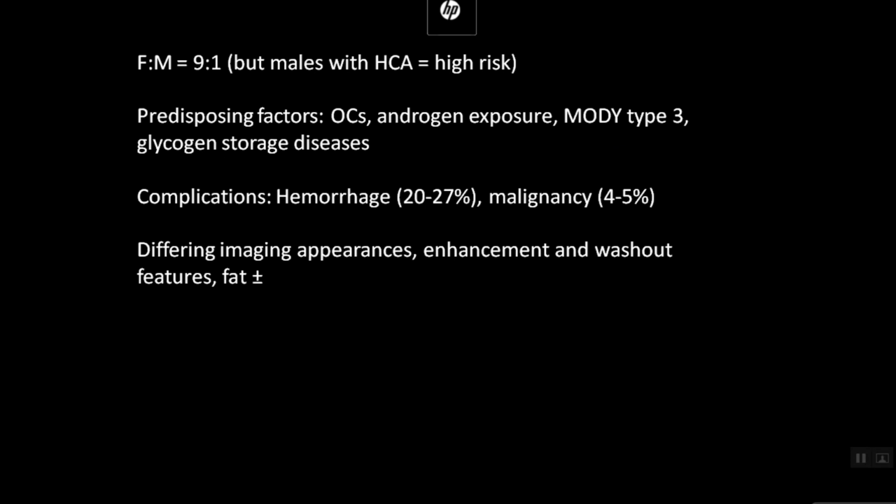Now, you can see any type of imaging pattern with adenoma. Some will enhance, some will not enhance, some will wash out, some will not wash out, some will have fat, some will not have fat. So it's a very differing imaging appearance, which is why it's very difficult to diagnose. But the main thing to remember is adenoma is not one entity, it's actually multiple different entities. There are different subtypes of adenomas, and these different subtypes will have differing imaging features.